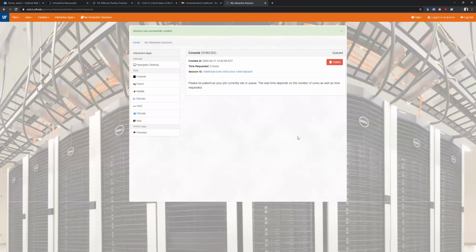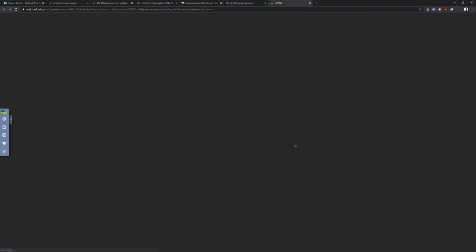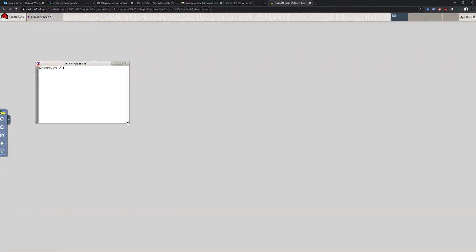So I'll launch that, and then we wait while this session is queued up on HiPerGator, submitted, and then run. This is just like you writing a submission script that you then sbatch. We're doing the same thing, but submitting this GUI console session as a script, and you don't have to write the script that does that for you behind the scenes. So we can launch the console.